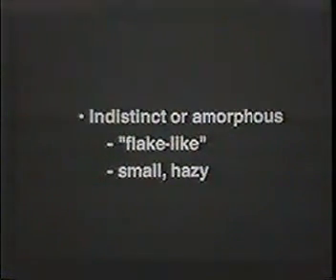In addition to the typically benign calcifications, there are the intermediate concern calcifications, and these tend to be indistinct or amorphous, sometimes called flake-like, small and hazy, and it's very difficult to determine whether these are benign or malignant. Here's an example of one of these groups, probably very hard to see because they are hard to see on a mammogram, particularly if they're located in an area of density, as these are. In fact, these were biopsied and did represent malignancy. So these can be malignant or benign.